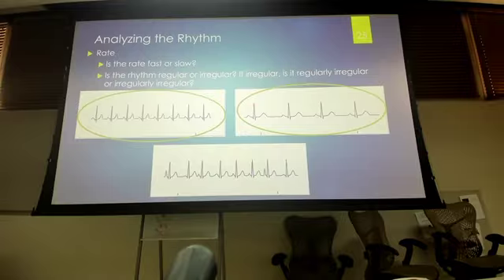I'm gonna take my paper and I'm gonna put it here. And of course, my paper doesn't reach all the way here, but if it did, I would put it there and I put a line right there. And I'm gonna take that and I'm gonna move it over here. And my line should line up exactly, okay?